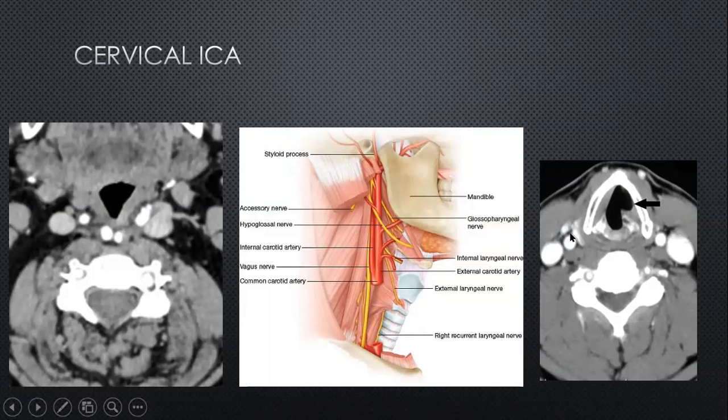the carotid sheath. And this is a patient who's had a previous surgery in the upper mediastinum with damage to the recurrent laryngeal nerve with the resultant vocal cord palsy. And here you can see that the vocal cord is deviated medially. And sometimes the internal carotid artery itself can be quite medially placed. For example, over here, you can see they are almost kissing in the midline just behind the pharynx. And that can be a dangerous proposition, especially in children who may thrust an object to the back of the throat, for example, a pencil, and that can have disastrous consequences.